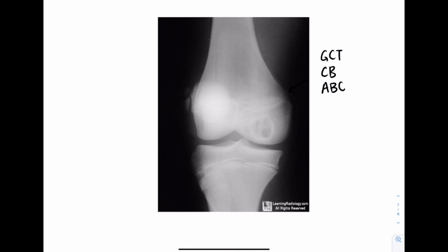Another thing that we could have with this individual is a Brodie's abscess, but you guys haven't learned about Brodie's abscess. The other is we do have a congenital variant right here, right? We have a tripartite, 1, 2, 3, tripartite patella, insignificant other finding. But we do have that right there. But we're looking right here.